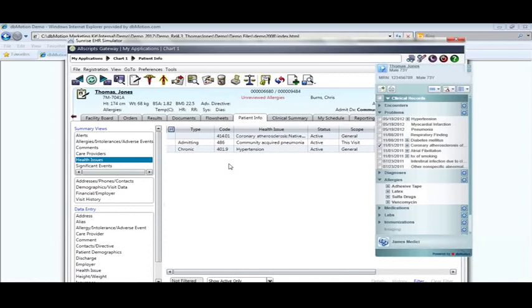So I'm going to stop for 1 second because I'm going to go off this view. We're going to come back to it. But I want to show you the details behind this with sort of our classic clinical views. But this is the basic workflow. So let me stop and see if there's any questions.